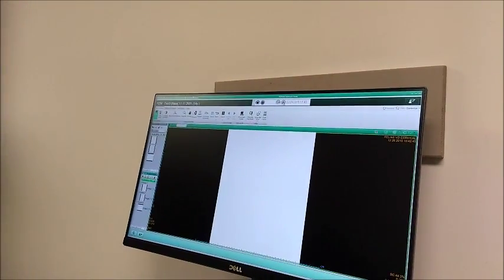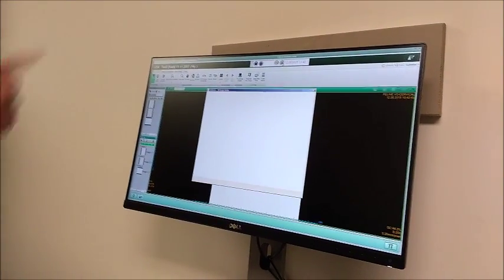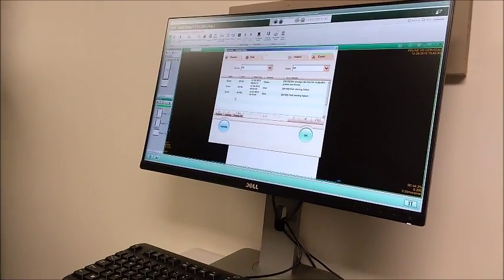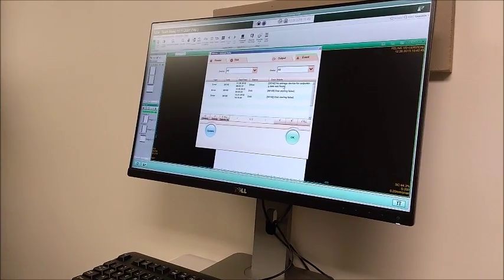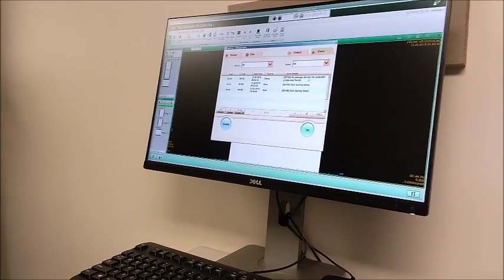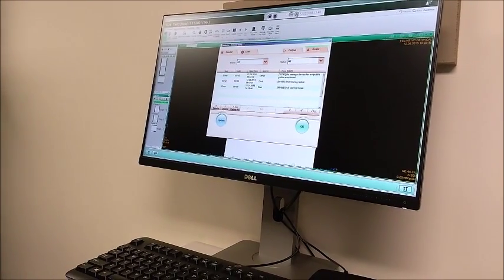If there's ever any problems with that, and once in a while the NAS is a little slow to wake up, you might come in and this thing's flashing yellow. You can click on this, and it takes you into this error console. It happened this morning because we didn't have the NAS turned on, so it knew there was no NAS and it threw an error code. It said no storage device for outputting data was found. Don't get real concerned if that's flashing.